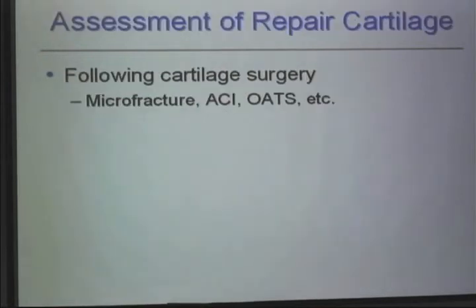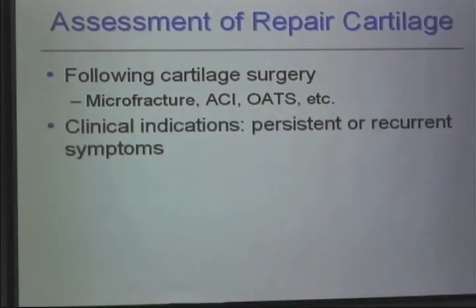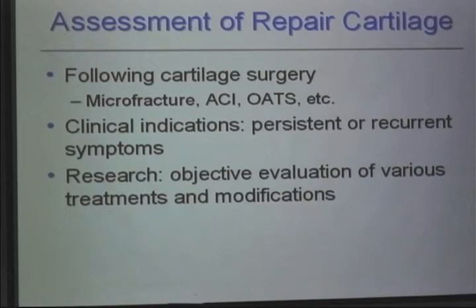Okay, on to assessment of repair cartilage. This will be usually following cartilage surgery. The clinical indications may be persistent or recurrent symptoms. This is also a research tool as an objective evaluation of various treatments and modifications.